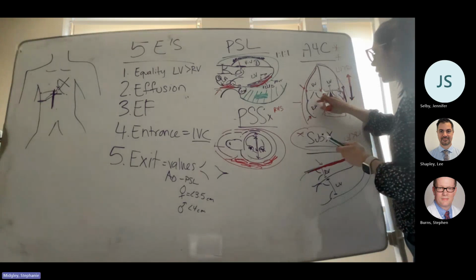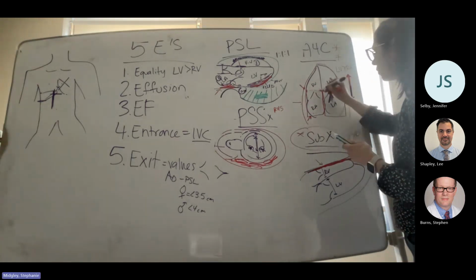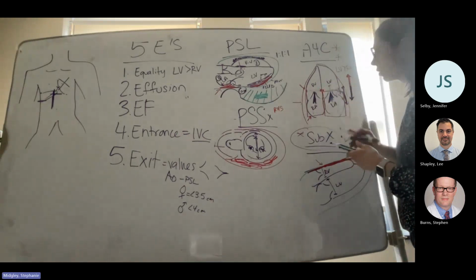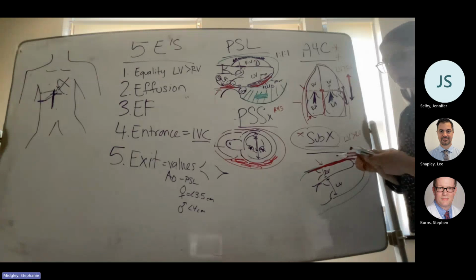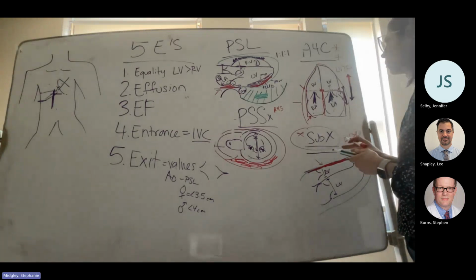And then it's the same thing for tricuspid regurg, right? So if I have blue coming from my valves back into my right atrium, it's tricuspid regurg. Everybody has physiologic trace tricuspid regurg. That's super normal.